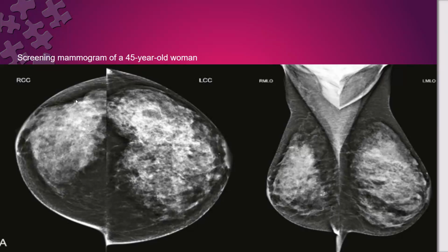And look, there are lines here. If you compare here, there is thickening. The areolar is thickened. And if you compare this area, you can see a little bit more vascularity, subtle, but it is there. Even the contour here and here, there are some subtle distortions.